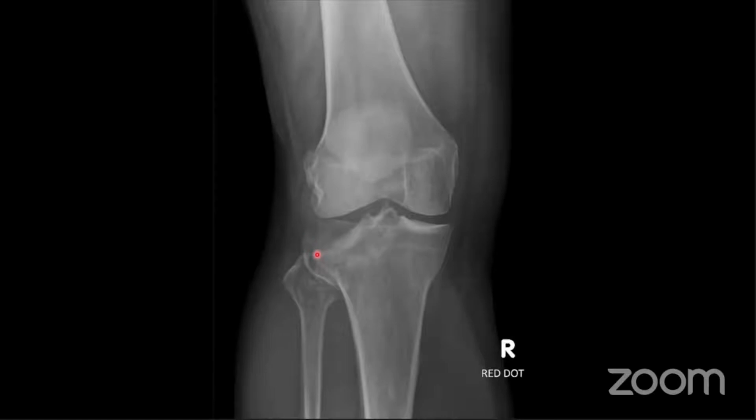There's a depressed fracture. So if we go back to our structured approach, you want to follow the cortex all the way around. If we look at the medial aspect, we see this nice sharp line of the cortex. It goes all the way around. It's continuous all the way. Whereas if you try and follow this, you get to here and there's a step. So that's a fracture. And then you follow it up to the top and this looks very indistinct. So this is all a fracture fragment that's off the tibial plateau.